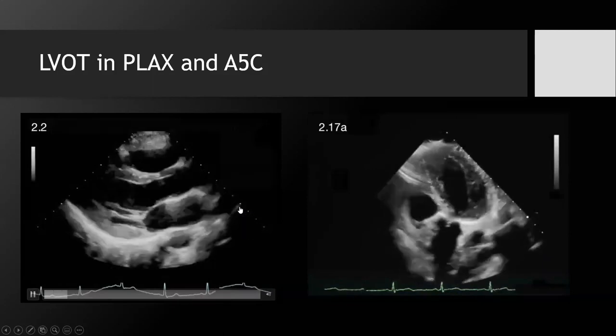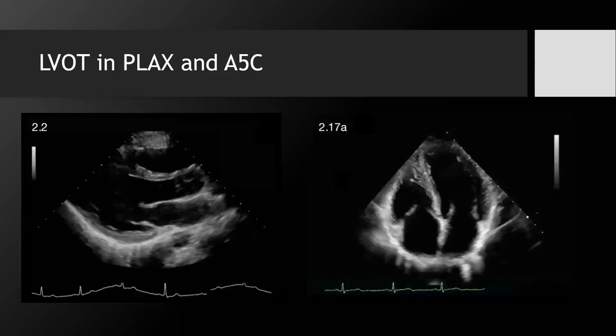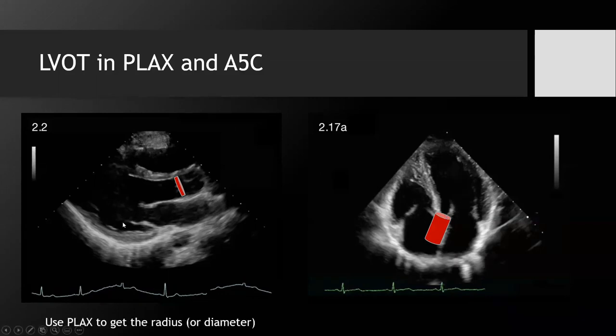And these are the clips that you're going to need to dig into, basically, to calculate your cardiac output, right? And so this area here, I made a very, very thin cylinder here, but this is the area where your blood is assuming that circular shape, right here and right here, so to speak, right? As blood is traveling out here, it's already not a cylinder. I should have made this shorter, right? But as it goes through that ring of the LVOT, right before it goes through the aorta, the blood is assuming a circular shape.